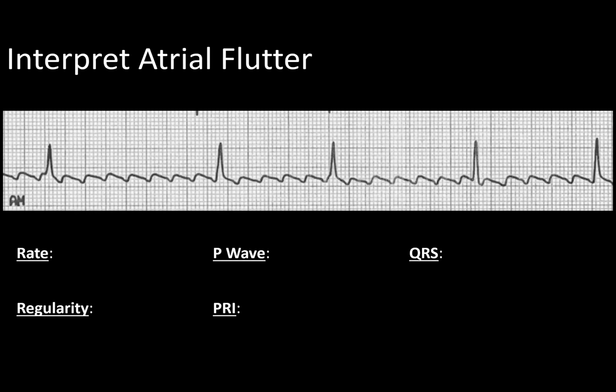Alright, so here we have another one, and this is a full 6-second long strip. It is a little bit irregular. You can see how there's a big break through here, and then it's kind of snug through here. So we'll just count these out. 1, 2, 3, 4, and 5.